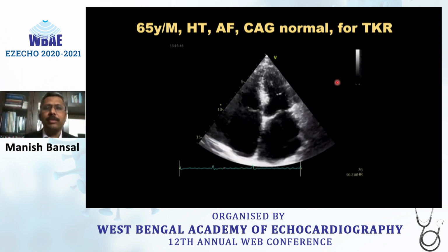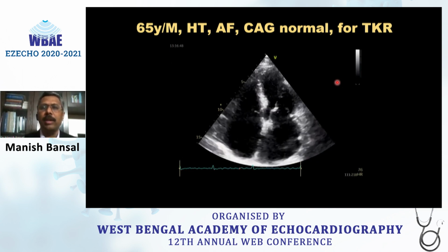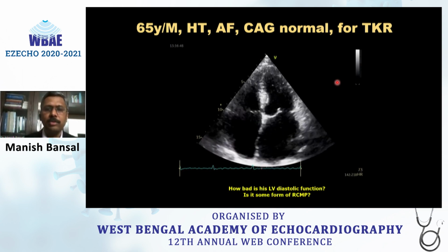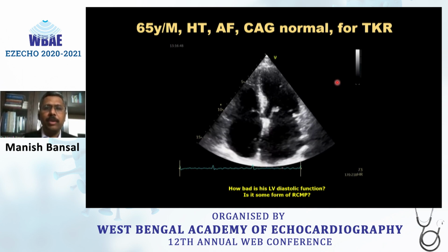Now, the question is whether this AF in him is just a consequence of aging and hypertension related atrial remodeling with some degree of diastolic dysfunction, or it was a more advanced diastolic disease of the left ventricle like RCMP, or it was a primary left atrial cardiomyopathy.